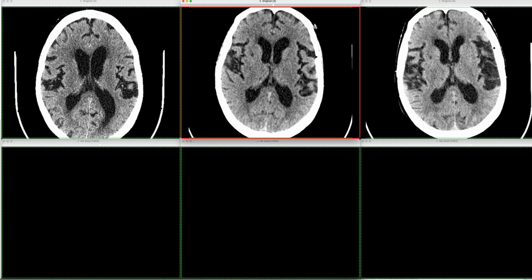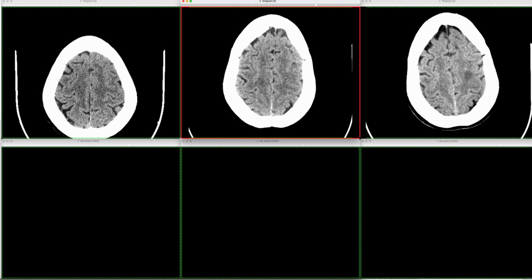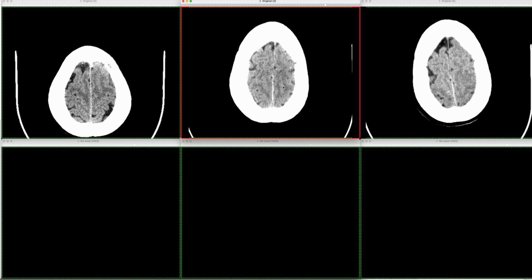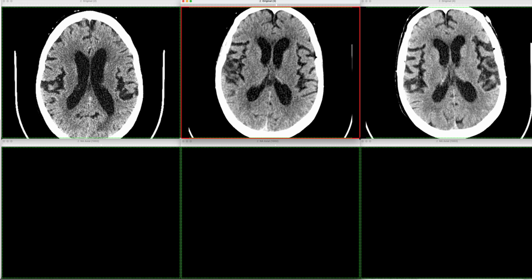through the study. There is a new small lacunar infarct since the old study from 6 months earlier. But the area of interest is actually in the left frontal lobe, where you can see on the 2-day after admission film that there's an infarct in the cortex. That's not really picked up on the original study. And now what I'd like to do is show you what the NeuroAlign images look like on the same patient.